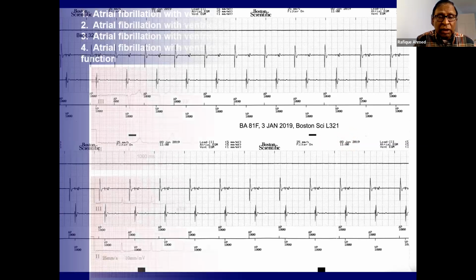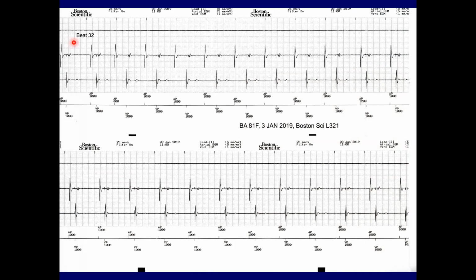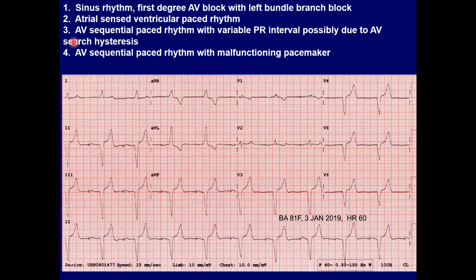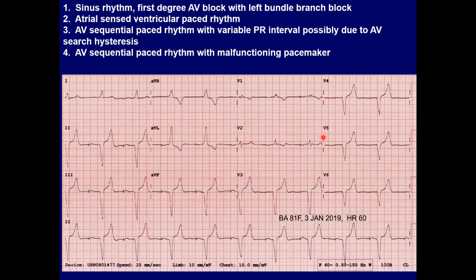Thank you. Sir, there's a question. Why is there an RBBB pattern in the ECG? In V1, can it confuse the... Yes. I wonder if there is a degree of fusion. I don't have the baseline ECG on this patient. It is because the QRS is relatively narrow. The other possibility is whether it's a biventricular pacemaker, but I don't think this was a biventricular pacemaker. It was a regular pacemaker. Interrogation shows it is a dual chamber pacemaker, but still V1 shows the RBBB morphology. Yes, you're right. Absolutely.